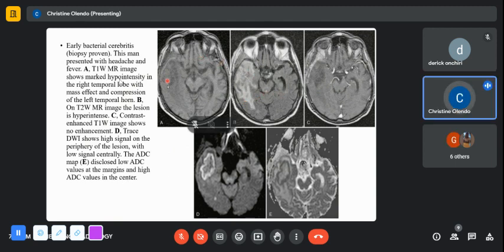Yeah, so on the T1 image, we're seeing an area of hypointensity. This is in the right temporal lobe, around this level. And on image B, on FLAIR, we're seeing that there is abnormal intensity, which is hyperintense, still in the area of the right temporal region.